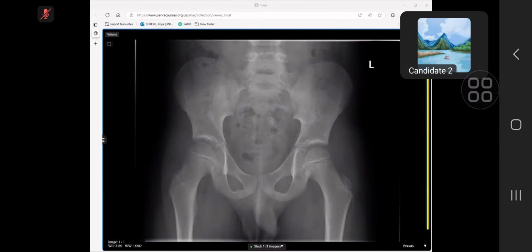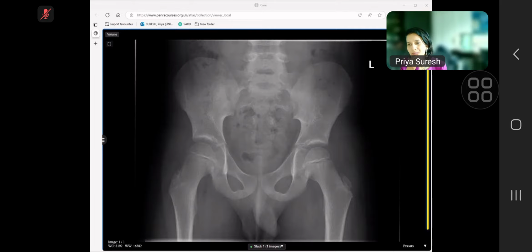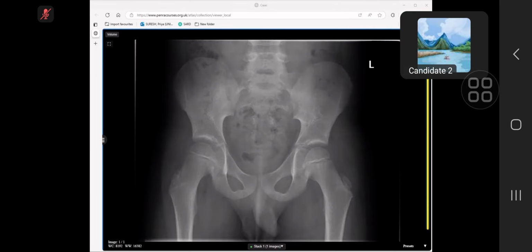I can appreciate that the line of Klein is not intersecting the distal 1/5 of the epiphysis on the right side. Also, the contralateral side looks relatively the same.